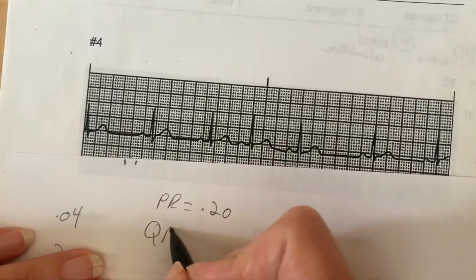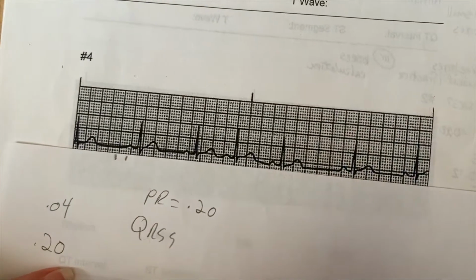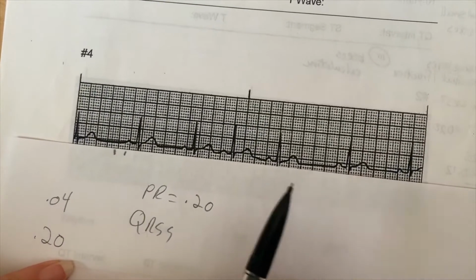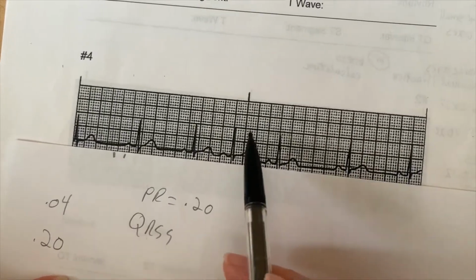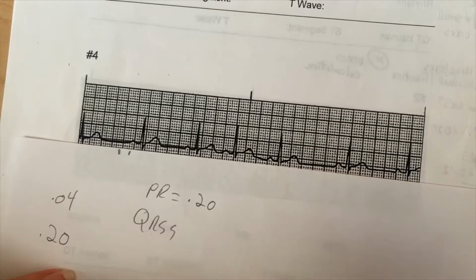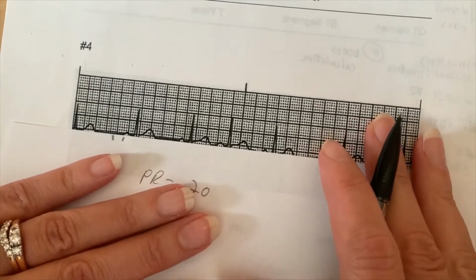I'm then going to go on and look at a QRS. I'm going to do the same thing. Now, measuring the QRS is really almost an academic discussion. The thing that you needed to know was, is your QRS wide or narrow? When you look at this QRS, you can already tell that it is narrow, which is really the only question you needed to answer. What you're doing then is deciding how narrow is it.